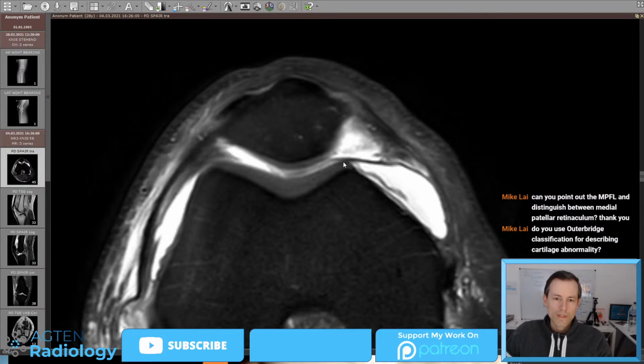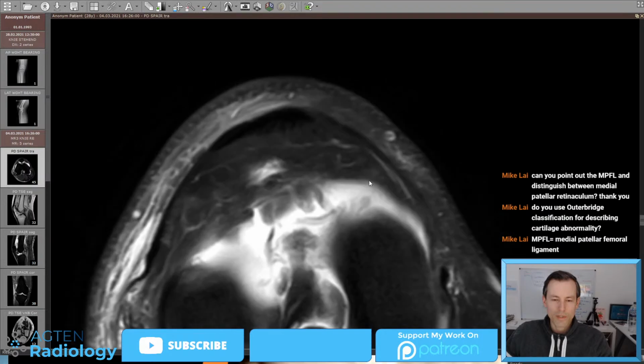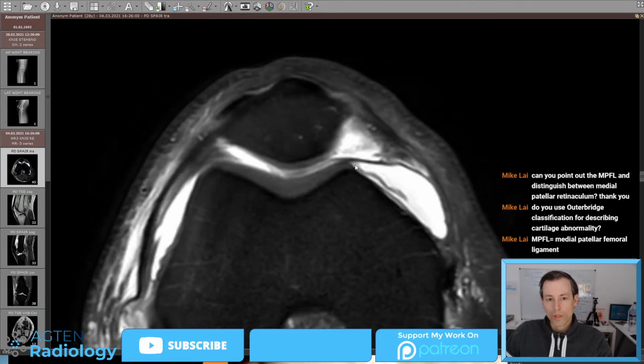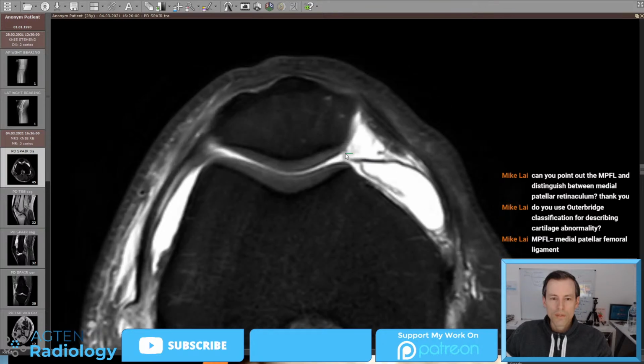And this is now like a normal plica. Then it goes down here and we kind of lose it somewhere there. So with plica syndrome, what you have to look out for is basically this structure, if it's swollen, if it's thick, if it's edematous. Normally if it's not really reaching into the joint, it's not really symptomatic. So it's more likely to be symptomatic or actually causing problems if it's large and thick and swollen.